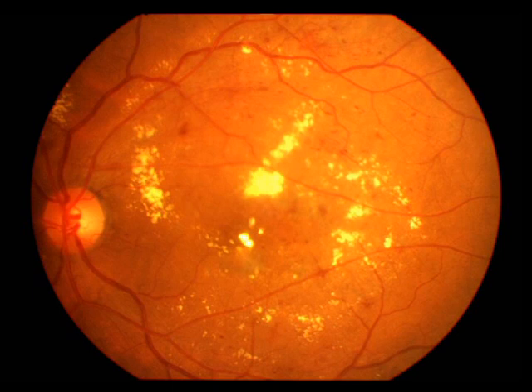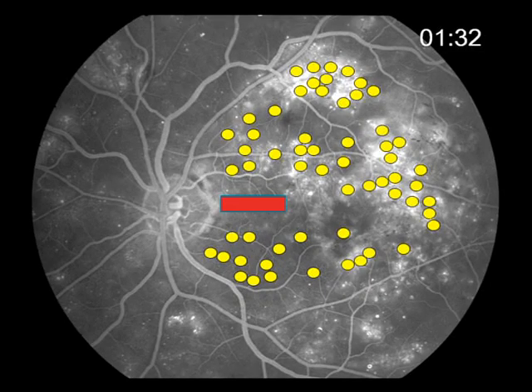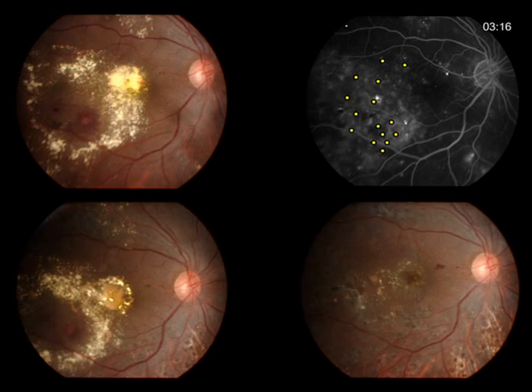When the leaking lesions are not obvious and there is a diffuse leakage from a leaky retinal capillary bed, a grid pattern of laser photocoagulation using light burns may be applied after good systemic control and/or in conjunction with pharmacotherapy, taking care to avoid treatment along the papillomacular bundle. The results of such treatment are not always bleak, even in seemingly dismal situations.